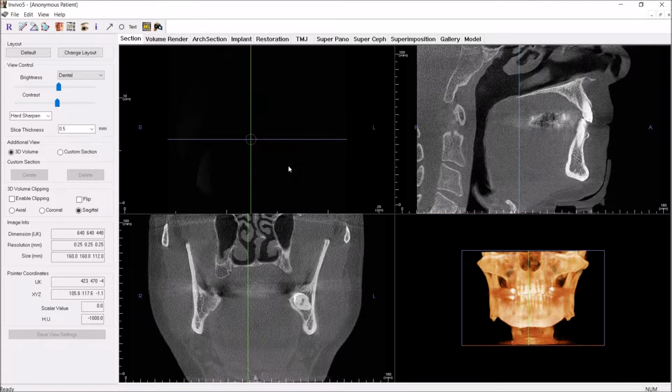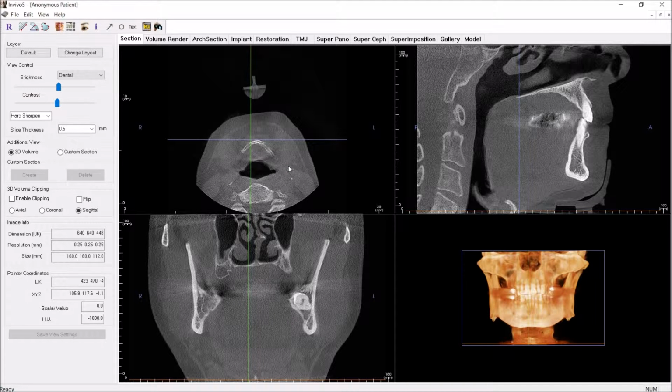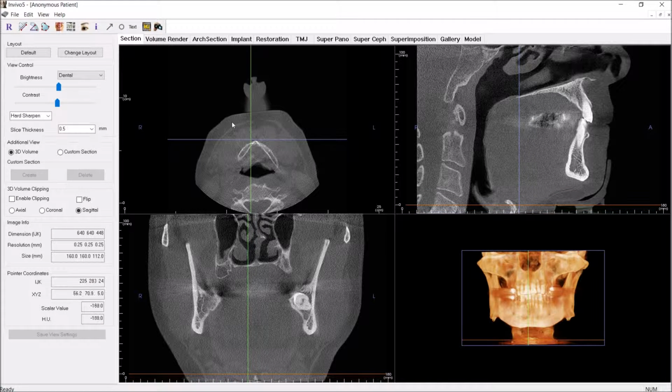So you have to look at everything in the image, and the question is, how do you do that? If you're scrolling through so fast, there's several hundred images. I think a good tip is to look at about a third of the image at a time. You'll divide the image horizontally into thirds. So here I look at the top, or in this case it's the anterior third of the image. And right now I'm just kind of looking at the neck, the platysma, the soft tissues.